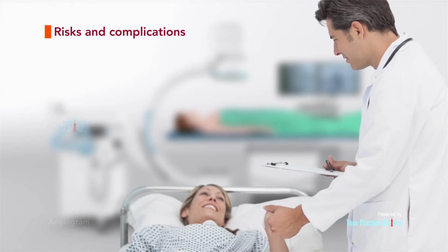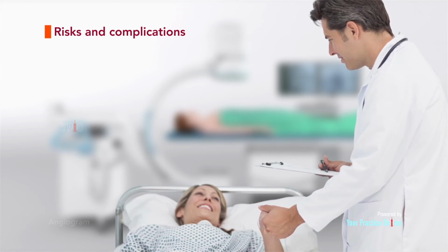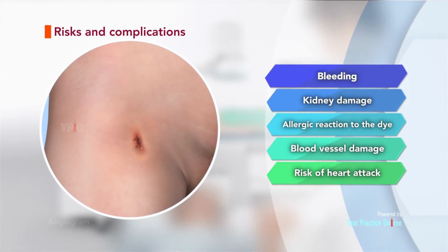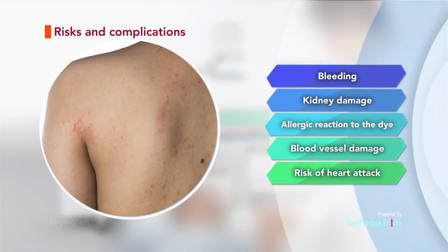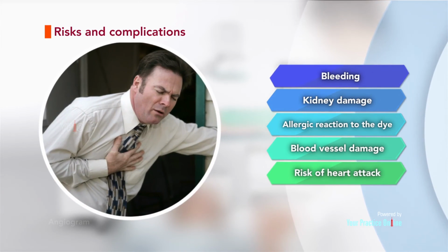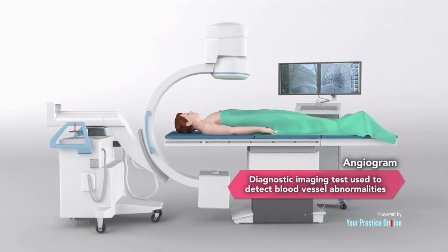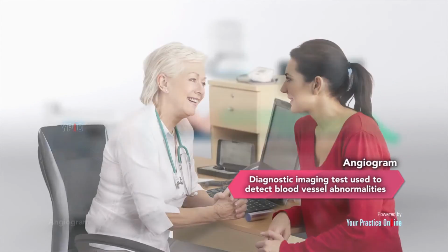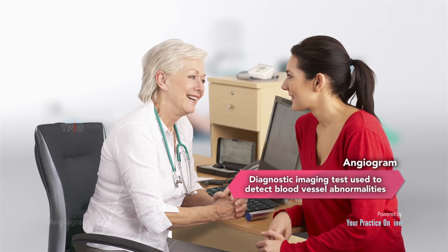Risks and complications. As with any procedure, angiogram includes potential risks and complications. These include bleeding or clotting at the needle site, kidney damage, allergic reaction to the dye, blood vessel damage, risk of heart attack. An angiogram is a diagnostic imaging test used to detect blood vessel abnormalities in the body. Talk to your doctor about any concerns you may have regarding angiogram before undergoing the procedure.